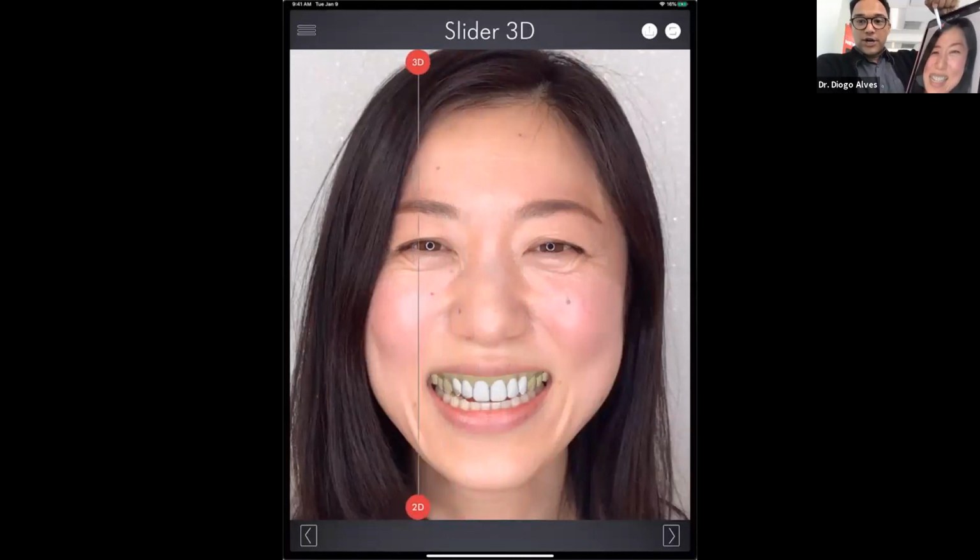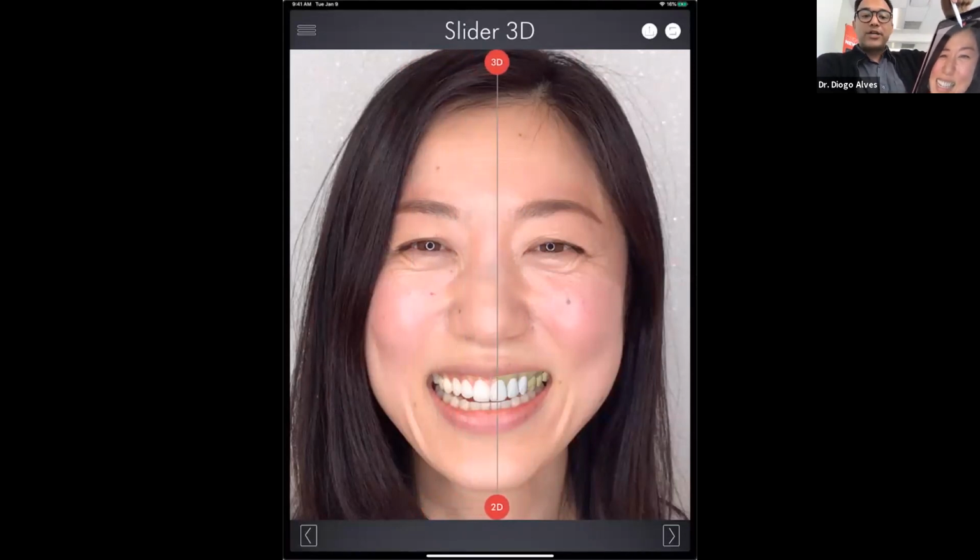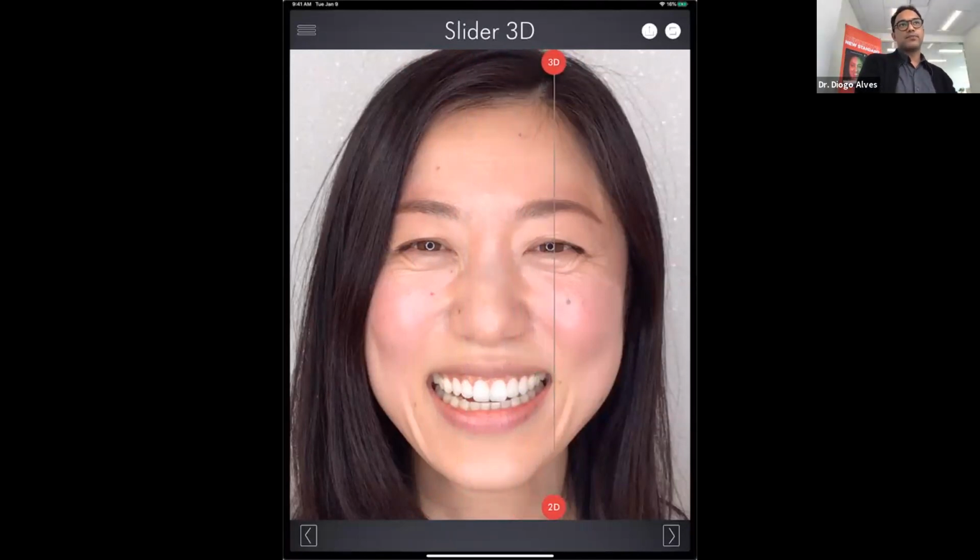What do I want to see here? I want to make sure that my 3D design looks just as planned, just the way that my patient wanted me to do. And this brings value to the ethical work. The patient will feel appreciated, knowing that you're following what you both planned before. And once you win your patient like that, your patient becomes your missionary. He or she starts to tell everybody about how amazing their doctor is.